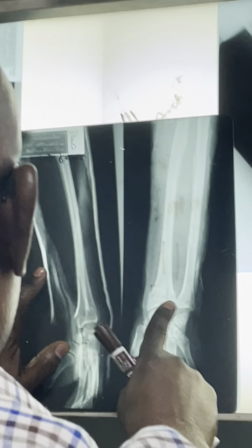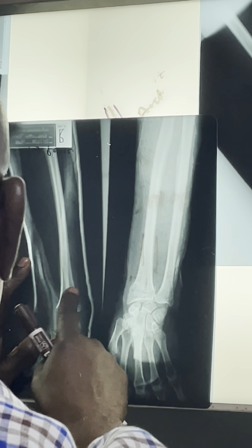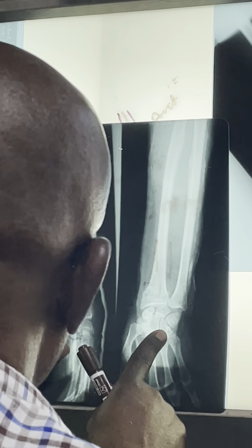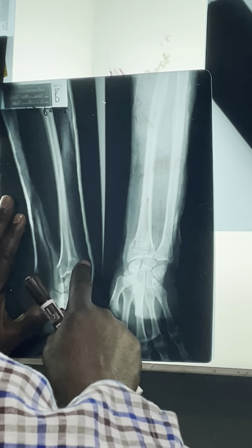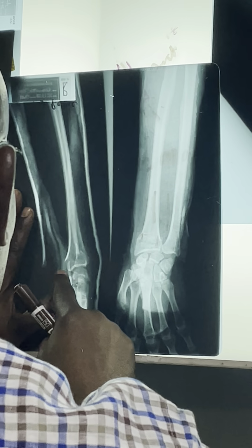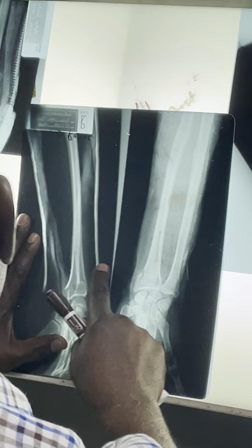Well, you see it right. I didn't make it up. It's right in front of you there. I mean, this person has made a good attempt. This would be acceptable, really, because you can get it to remodel. So if you go on this now, you say this is acceptable. It's in the plaster, the splint. It's acceptable because we know, although it's not perfect, it will be remodeled by whose law? Wolff's law, right? W-O-L-F-F.